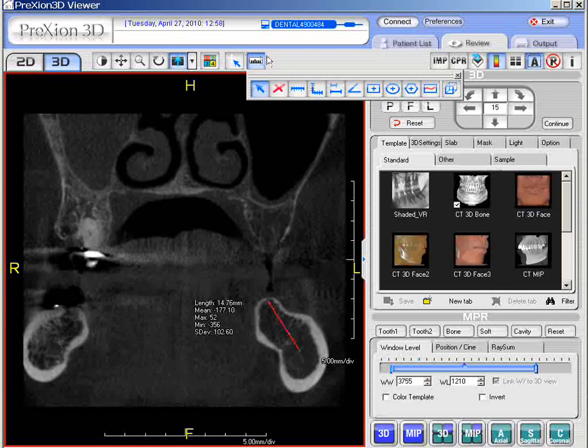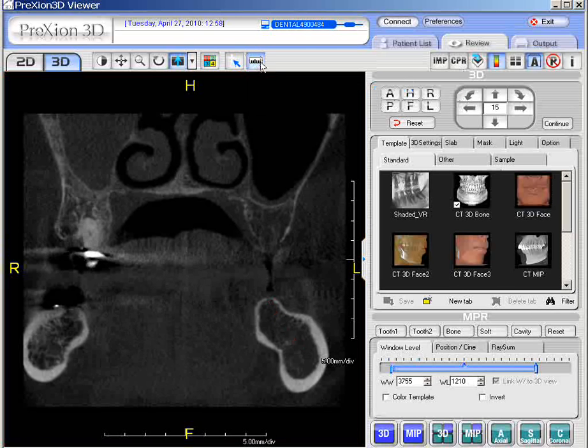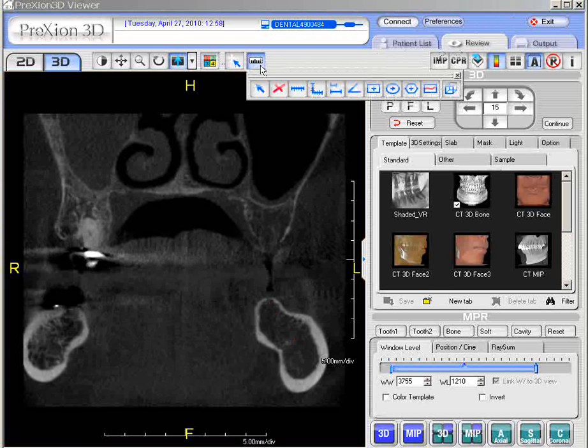To quickly get out of the measurement tool, click it again, and all of your measurement tools in that toolbox have been removed. Once again, though, we're going to left click it, open the toolbox, and go now to this feature called line segment. Line segment is if you want to measure apart from different sections.